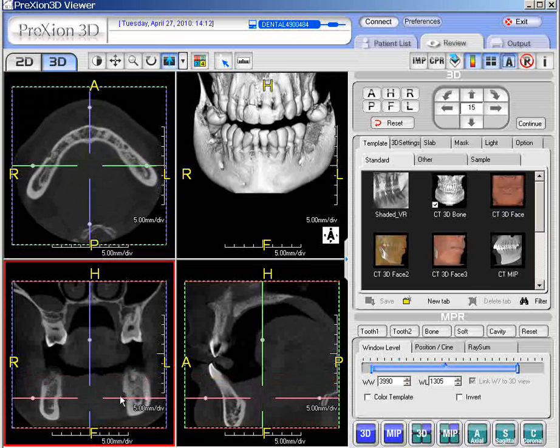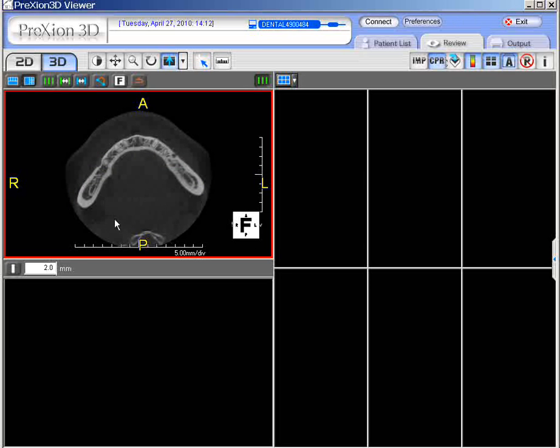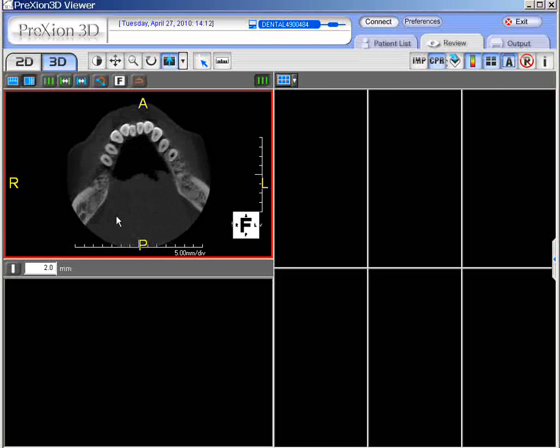So once you've selected this pink line to go across what appears like the mandibular canal, go to CPR function now. Now what we're going to do is scroll the wheel upward. So here is the mandibular canal in this particular section. We're going to start as far back posteriorly as we can see it. Once again, hold the control key down. You're going to get this little light bulb appearance. Left click the green dot into position, again with the control key held down. Here is the little outer posterior edge of the mandibular canal on the right side. So we're going to left click it in.